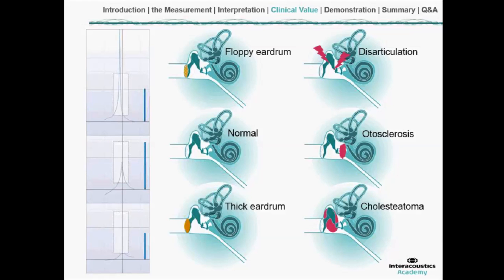The example that I mention here is that the skin of the tympanic membrane, if it grows into the middle ear cavity and forms a cholesteatoma, can really take a lot of space and be in the way of the ossicular chain. If it's not removed, it can dissolve parts of it. It's quite a serious problem, and the tympanograms of these two cases, again, look quite the same.